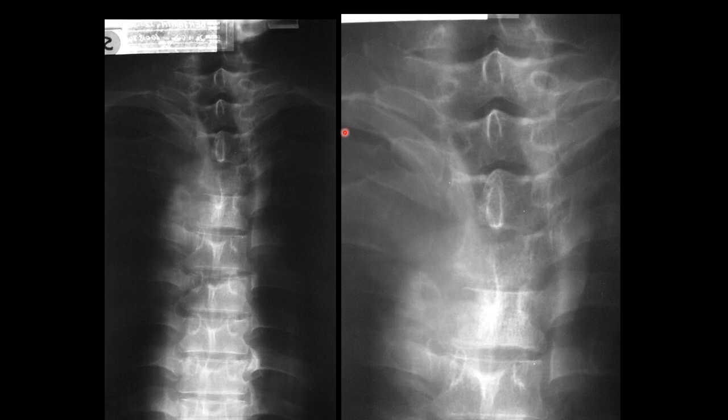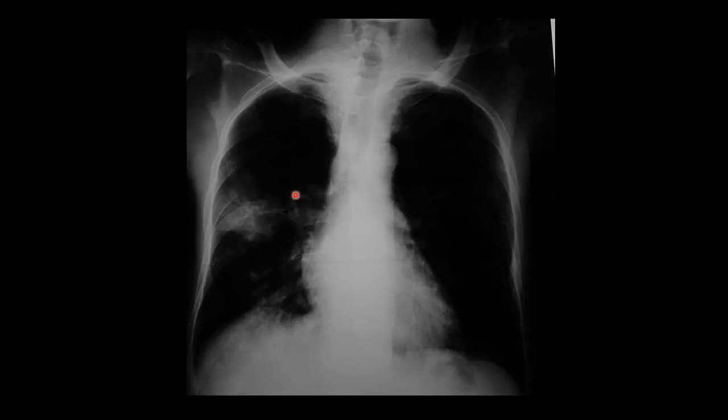Here's an example of a patient that presents with increasing myelopathy. When you look at the spine, you see the spinous processes. You look for the pedicles, which are the eyes of the owl, and the spinous process, the beak of the owl. You see the pedicle, missing a pedicle, missing a pedicle. There's a lesion that's encroaching onto the spine and spinal canal. You can see the hilar lesion in the lungs here. This is a patient with CA lung, local erosion into the spine. This patient will get palliative care and probably have death within the next few months.